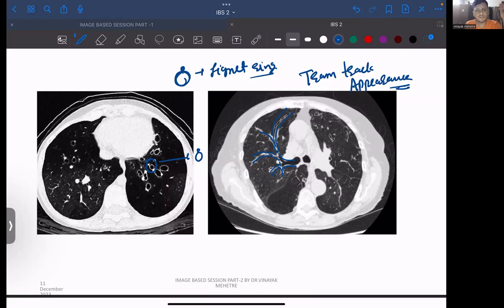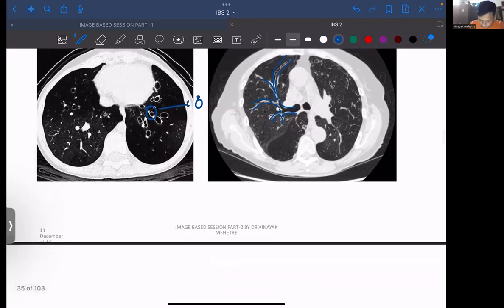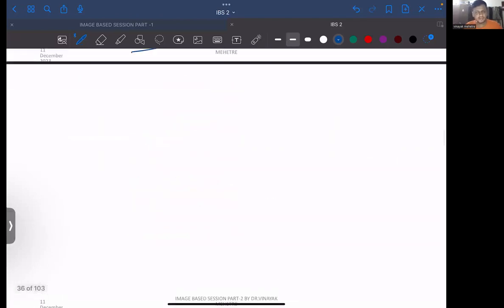So do not make a diagnosis unless you get something from the question. कुछ तो हिंट लगानी क्वेश्चन में कि ये क्या पूछना चाह रहे हैं. ओके, क्लासिकली इसको ही हम बोलते हैं ब्रोंकिएक्टासिस, है ना? ब्रोंकिएक्टासिस सिग्नेट रिंग अपीयरेंस क्लासिकली इसमें मिलता है. दैट डजंट मीन्स कि बस इसी में मिलेगा. क्वेश्चन देखना पड़ेगा. रिमेंबर, चेस्ट एक्सरे एंड सीटी स्कैन हर बार सेम नहीं आते.